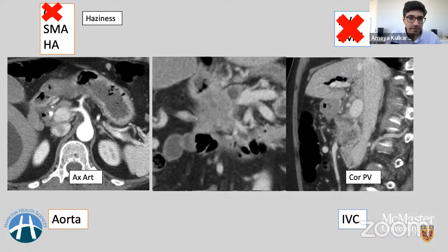What else is happening here is that, if you remember, the SMV and SMA are essentially responsible for the vascular supply and sustenance of predominantly the small bowel, as well as some portions of the large bowel. So as the liver is important, even the mesenteric supply to these important small bowels is also important. So if there is any tumor present in the SMA or SMV, now we have to start looking at what is happening to their branches, most commonly the first branch of the SMA or the first tributaries of the SMV. So in this case, you do see that these tributaries are also involved by the tumor.